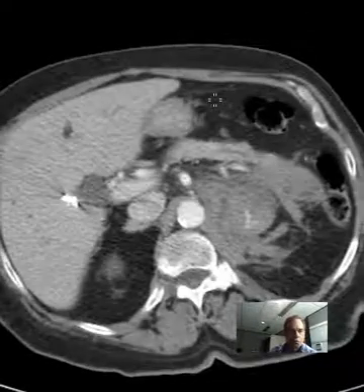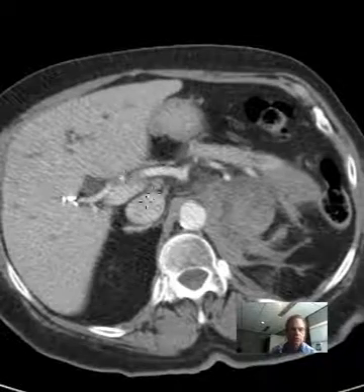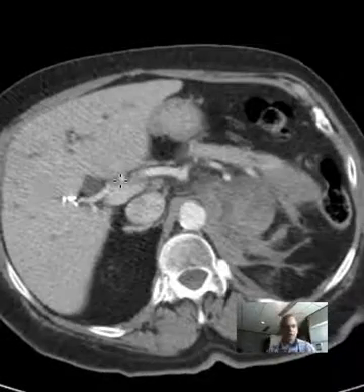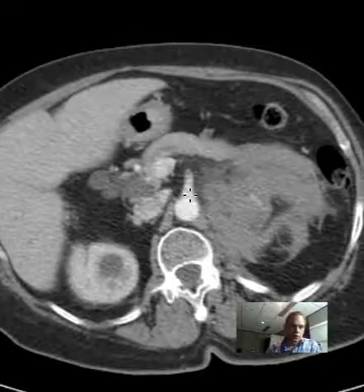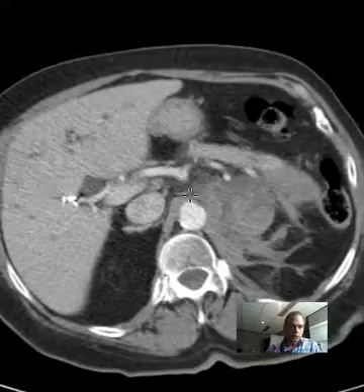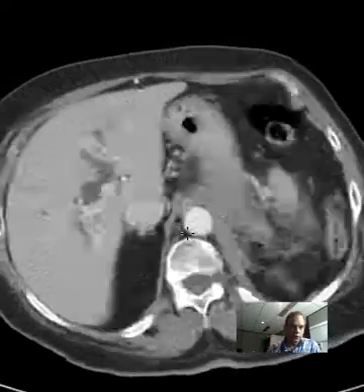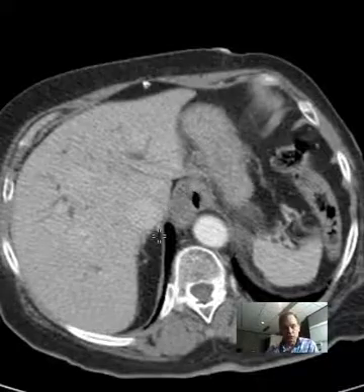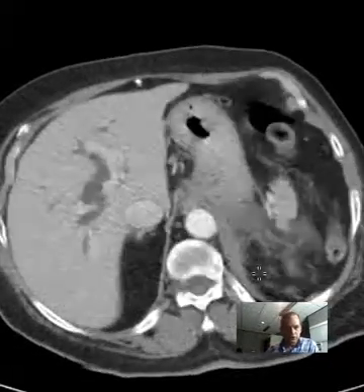Anatomically, liver, we went through that. Look here, this is the porta hepatis. That's where three major structures course, and they are the hepatic artery. The hepatic artery is one of the branches of the celiac artery. So if we go up here, there's two branches off the abdominal aorta. Going downward, let's go up to the aortic hiatus. We see here again the esophagus is going through this hiatus between the right crus and the left crus of the diaphragm.